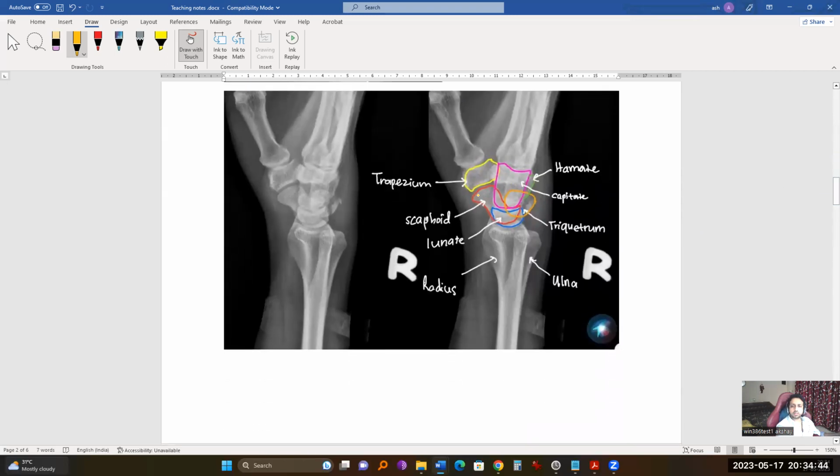A few more examples. Again, anteriorly you'll see the trapezium and the scaphoid, which are very prominent. And the large bone behind that is the capitate. And the moon-shaped lunate in contact with the radius, you'll see over here. And if you're interested, you can learn one more bone, the hamate over here. It's of not much significance, but you can learn it.